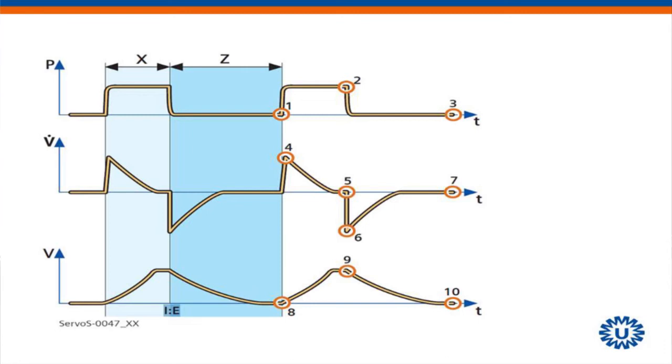I think you're correct. It's positive. When there is a leakage, for sure, on the volume side, the trace of the volume doesn't go back to 0. That's correct. It's always a positive, because the leak is a positive flow. But you can see that flow is interrupted here. Yeah?